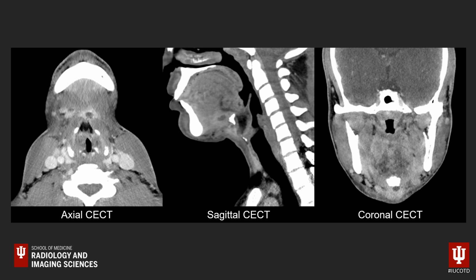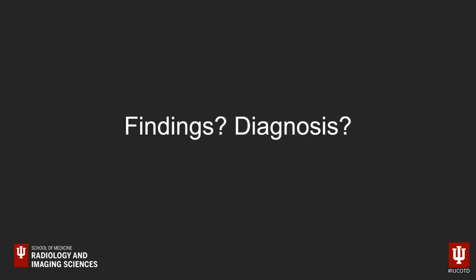And in fact, I'll tell you, if you pressed him further, you would find out that this is not the first time it's happened. Okay, so two questions this time. First, what are the findings? And then the second question is, what's the diagnosis here?